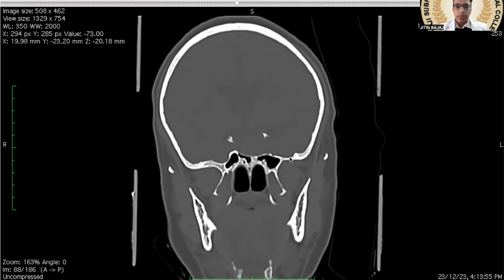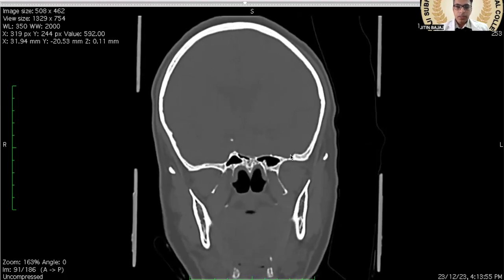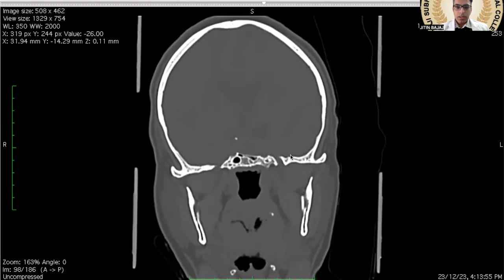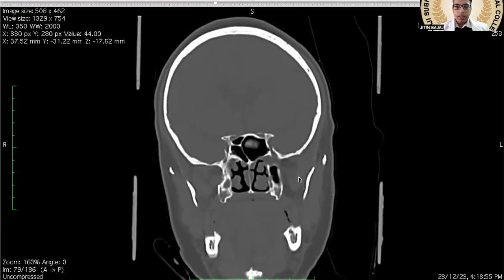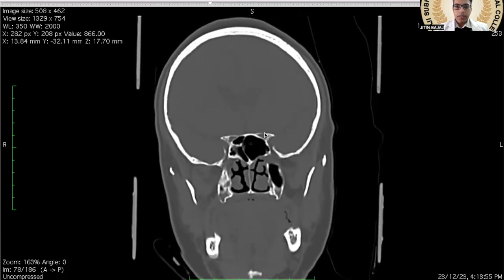Medial and lateral pterygoid plates. And this is the area for foramen ovale. So you should look at all these things. Another important thing is this anterior clinoid process, and this is the optic strut, which makes the boundary between the optic canal and superior orbital fissure.